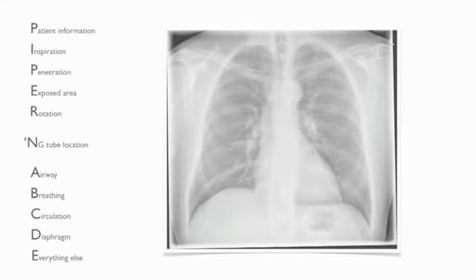The mnemonic stands for Patient Information, Inspiration, Penetration, Exposed Area, Rotation, NG Tube Location, Airway, Breathing, Circulation, Diaphragm, and everything else. We will now review each of these in turn, beginning with patient information.